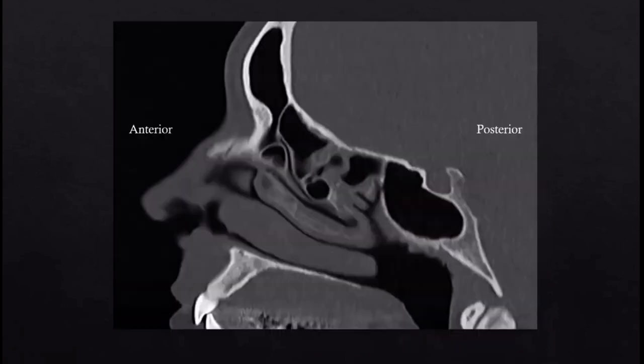So here we will look in a bit more detail at the CT scan. What you can see here is that the most anterior structure on the face is the nasolacrimal duct, and that therefore drains the lowest. So the law states the more anterior it is, the lower it drains. So the anterior bit, which is the nasolacrimal duct, goes into the inferior meatus.